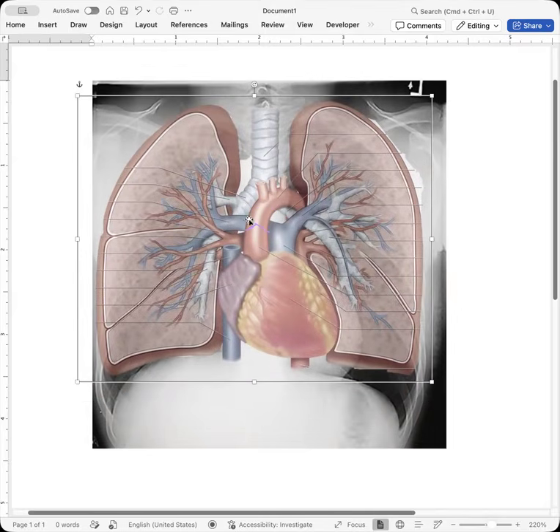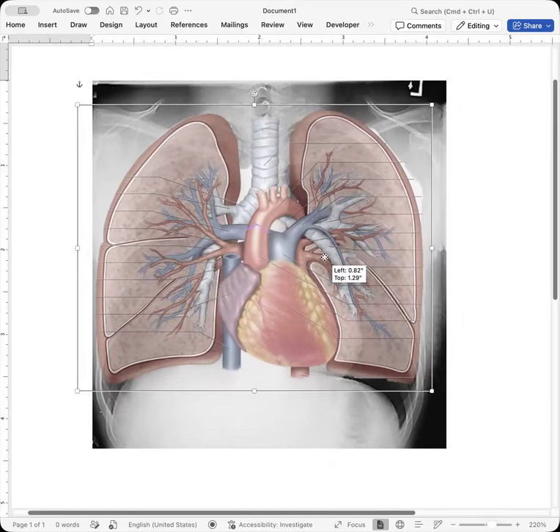And then we get into the secondary and tertiary bronchi. They're going to extend to the alveoli, which is where we deal with blood gas exchange and so on. But anyway, anatomy in this chest X-ray image.